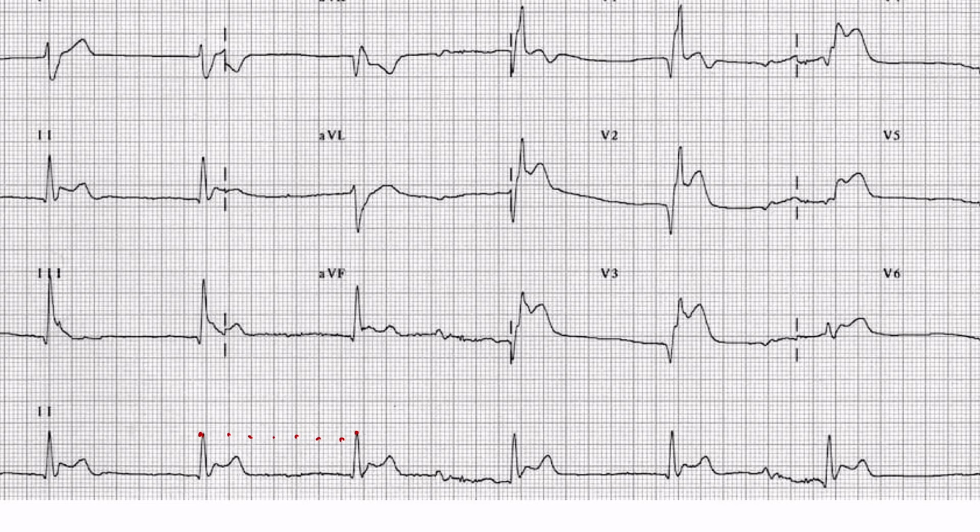And then if we move this over, it's the same space all the way across. So we can kill two birds with one stone here. 300 divided by 6.5 equals, it's around 46. And we know that it's regular as well.